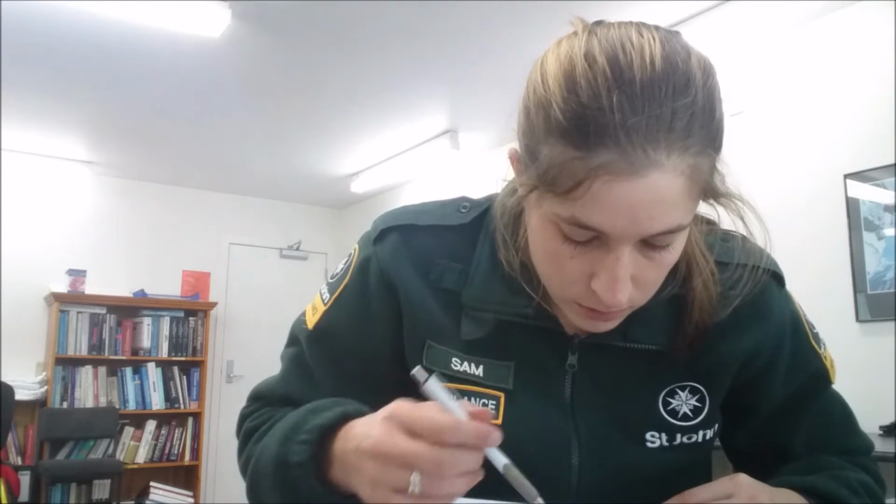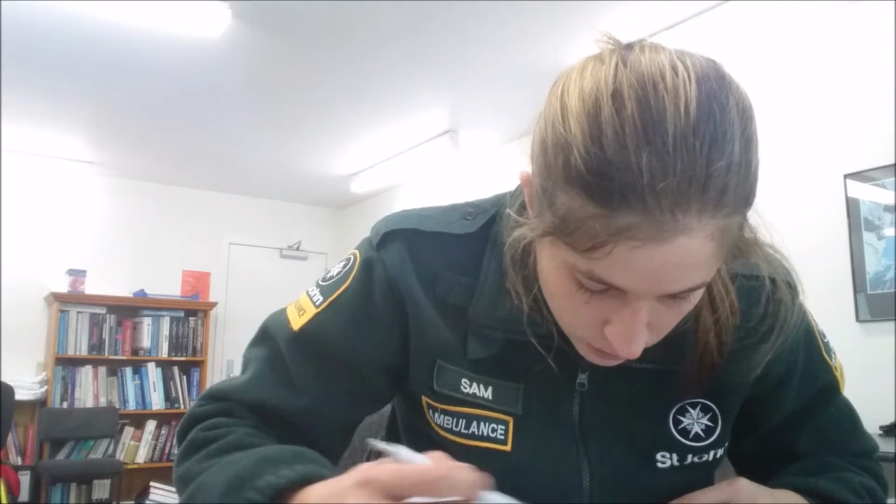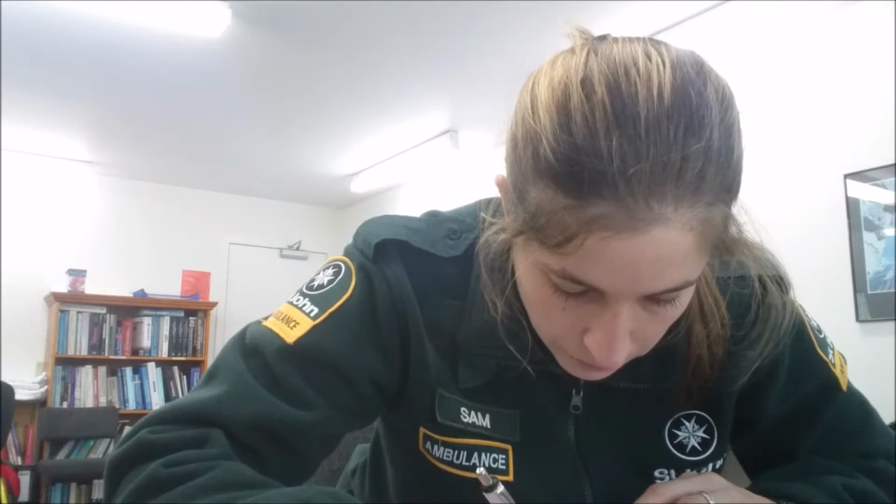Q waves: I don't have any. I can't see any pathological Q waves, no wide or downward deflection Q waves.